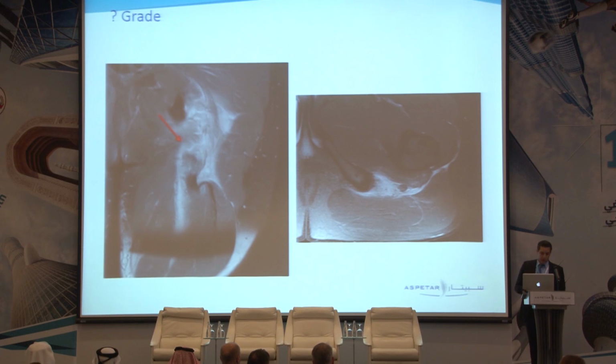So here's a 31-year-old athlete. It's not going to guide the decision into the return to play, but the clinician was suspecting grade 2/3. Here you can see that there's a complete tear of the hamstring tendons from the ischial tuberosity attachment. There's a fluid-filled gap measuring about 4 centimeters. There's no bony avulsion. You can see on the axial fluid-sensitive sequence, there's a complete tear. It's not going to be the final decision maker, but you could tell the clinician what's going on, and it will give them an idea, and they can give that idea to the player or the coaching staff.